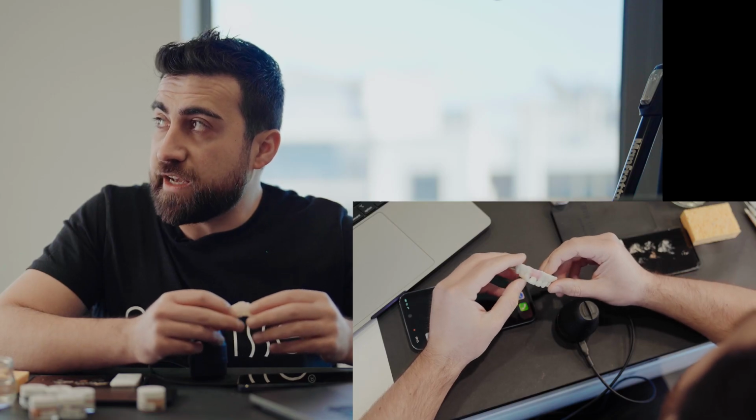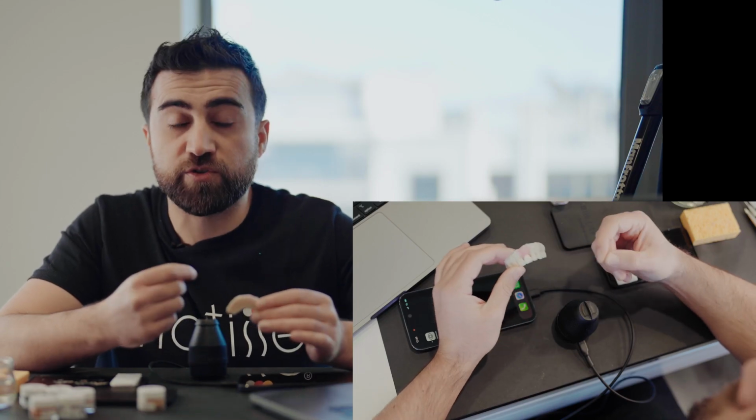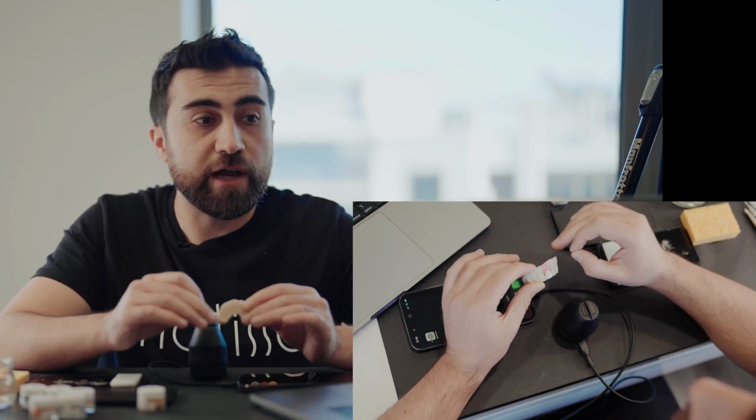So our crown is fired now, it looks very nice. And now what we can do again is to measure with Optishade and to see the match after firing, because after firing it, the color is always changing a little bit. So what you can do in this step is you can verify the color match, how good it is. And if you want, you can again make a photo from this step, upload it in the Staining Studio and get some correction recipes if needed. Or if you want to work on some details to perfect it, you can do that as well.